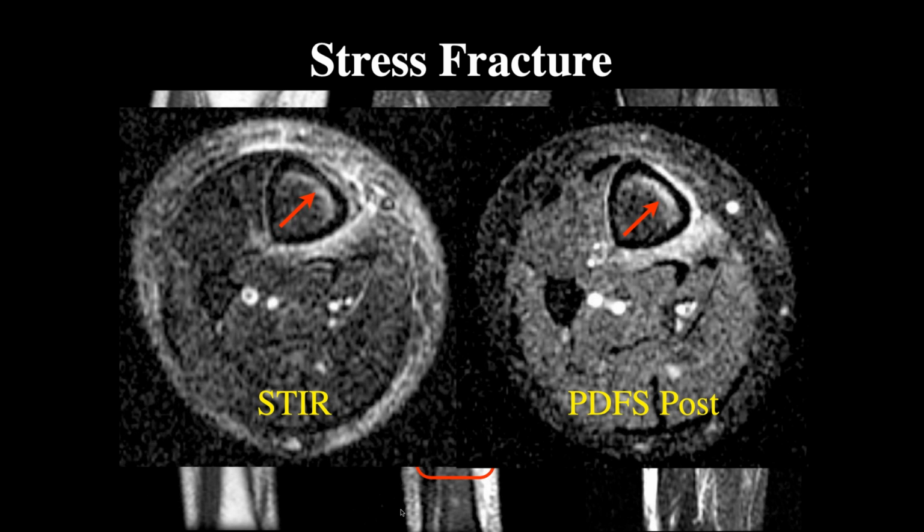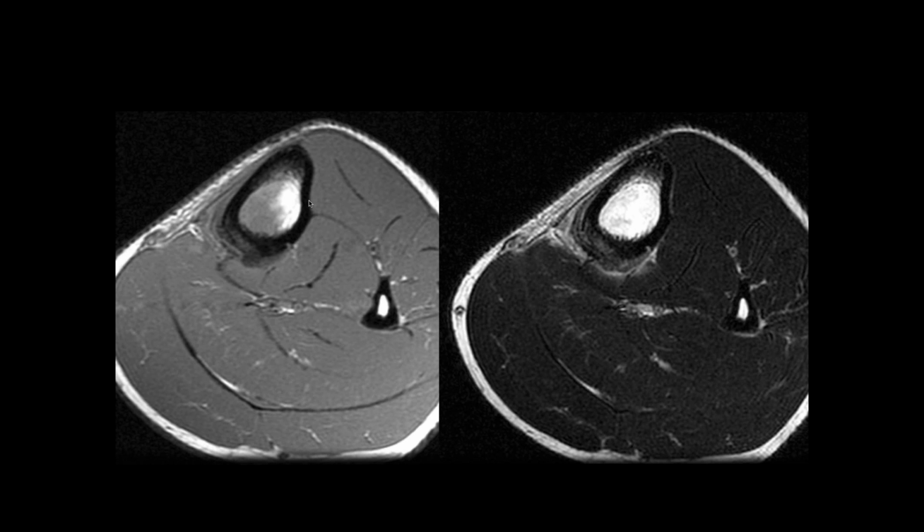I was going to say that there's not enough edema around there to think about infection. And the edema with infection almost always centers centrally here, whereas often with stress fractures, it's subcortical like this. So this is more a stress fracture pattern rather than osteomyelitis pattern. And you would have swelling outside that bone too. Yeah, we had a little bit of edema in the surrounding soft tissues that Jennifer pointed out.